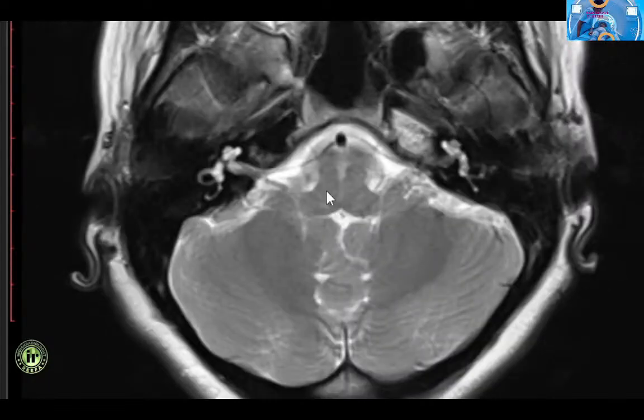Further cranially, the anterior eminences are formed by the pyramids and olive. The posterior eminences become more prominent, forming the inferior cerebellar peduncles. The dorsal surface of the medulla becomes the floor of the 4th ventricle. Along the lateral aspect, the 4th ventricle communicates through the foramina of Luschka with the cerebellopontine angle cisterns. This is an important pathway for the spread of the intraventricular tumors into the subarachnoid space. The medulla contains the cranial nerve nuclei of 9th, 10th, 11th and 12th nerves.